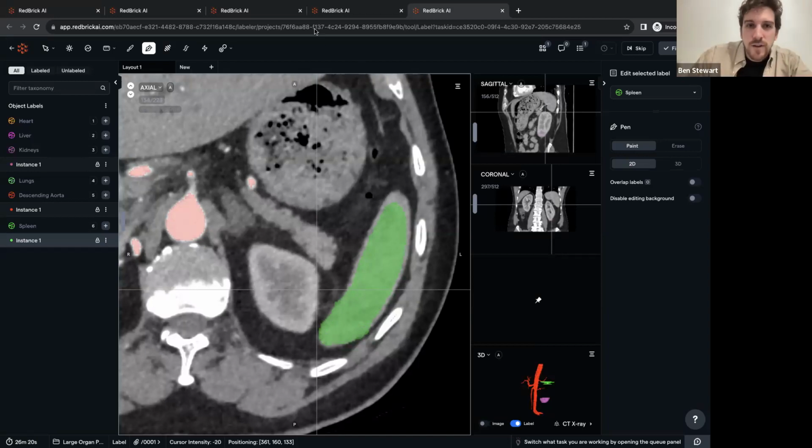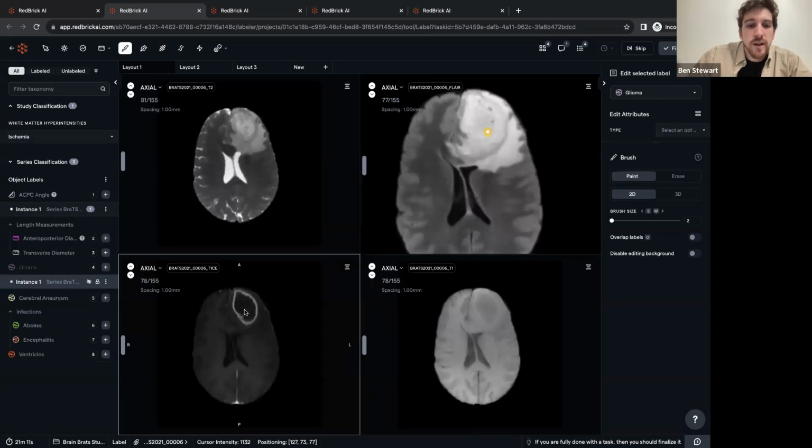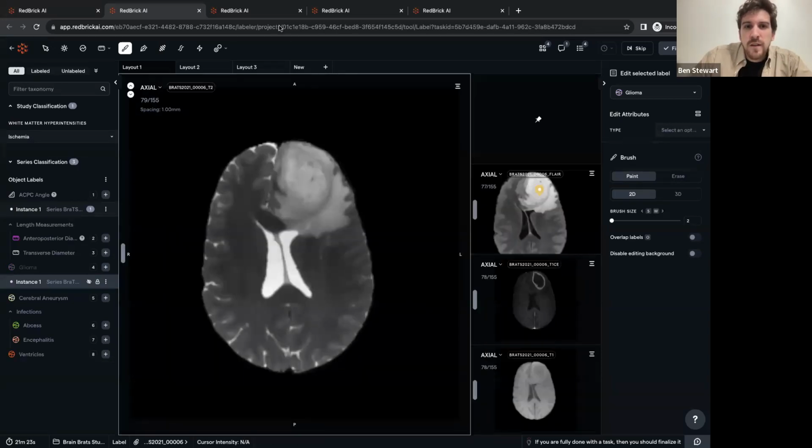We have another question. What can I do? A demo of the region grow tool on a contrast study. Yes, are you referring to, well, I could just very quickly go to a T1 contrast enhanced. Would that hopefully work for your purposes? I'll do a T1 contrast and, well, maybe let's do a T2. That's probably going to be a little better here. So if that does not work, let me know.